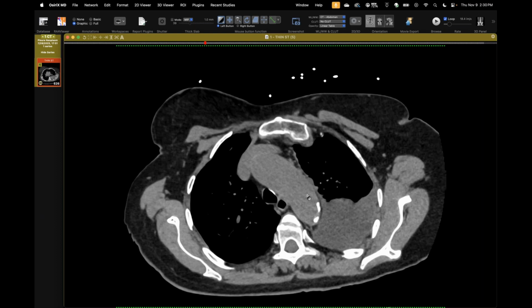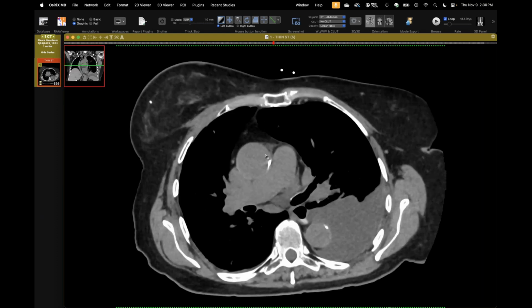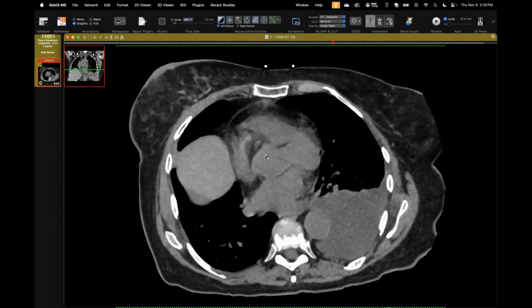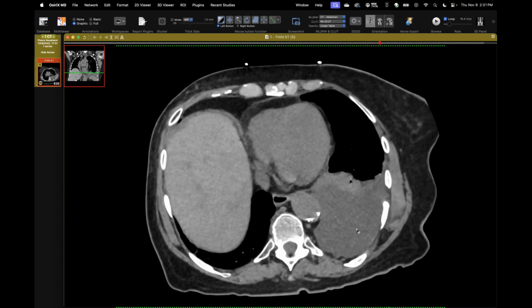The other thing, Jeff, is that sometimes they're myxoid, and this kind of looks myxoid. So I wonder, was this really liquid? Was it really an effusion, or was it just a gelatinous tumor? That's a good question. I don't know, because no one went in there surgically. Of course, it was done with a thoracentesis. They did the cytology, and that is how they made the diagnosis. I have not seen any follow up on this case. Just a little bit odd.